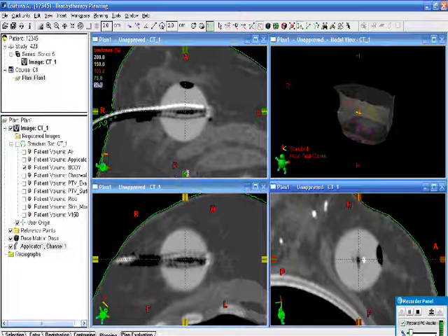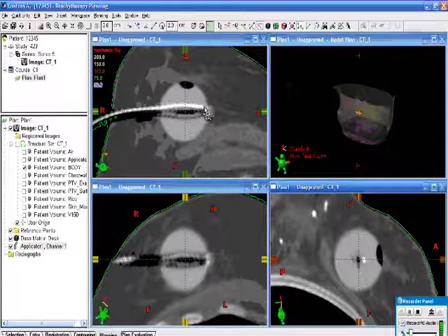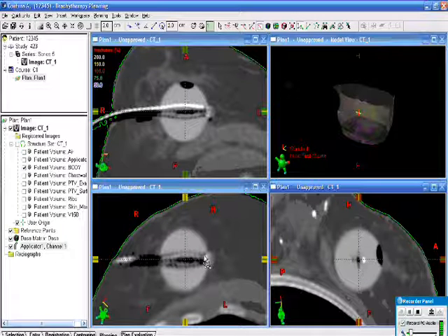So all I have to do is create it, and channel 1 is right here. And now what we want to do, you can see the little plugs here in the channels. We want to start reconstruction from the end of that plug, right there. And in channel, that's channel 2. Here, we're going to start here. So in this case, we're going to start right here.